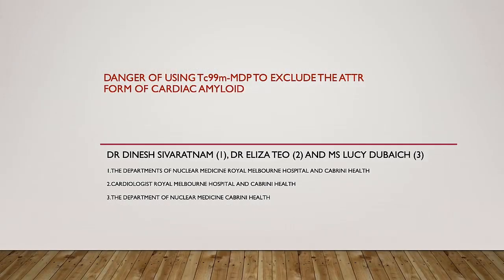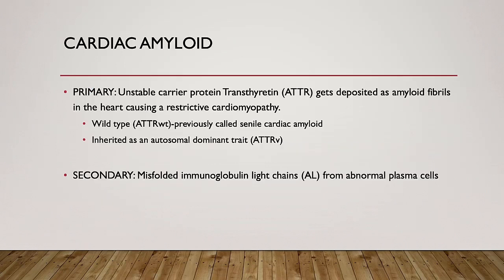Hello, I'd like to present a case illustrating the danger of using technetium-labeled MDP to exclude the ATTR form of cardiac amyloid. What is cardiac amyloid? There are two forms.